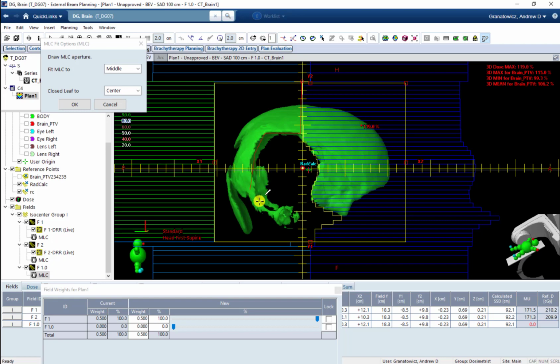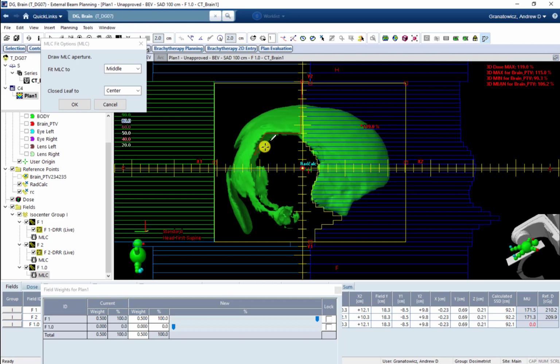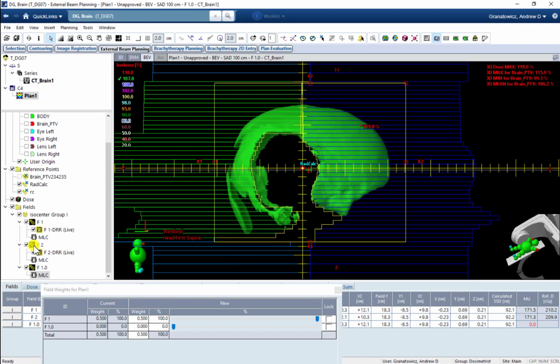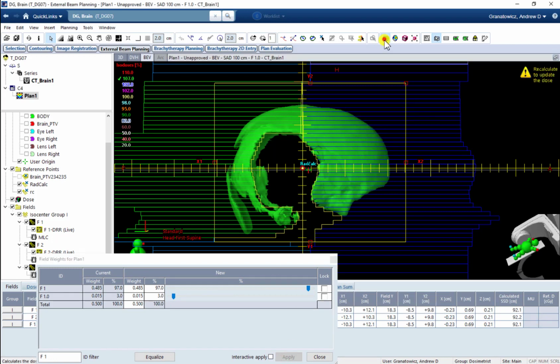So it'll take some experience to get used to, but if you turn your line to segment in 3D like we did, you can get a little bit of depth perception. So you can see this line right here that I'm drawing on. This green is towards us. It's on this right side of the head. Okay, so we're drawing a line right there at that green. And then what you see, this darker spot is on the other side of the head. Okay, so it's kind of a concave volume of dose, right? So I'm going to only focus on the line closest to me for this side. Something like that. And then from our other field, F2, we're going to take care of that dose on the other side of the head. So I usually do one at a time, and 3% is usually a pretty good starting point when you're just learning to plan.